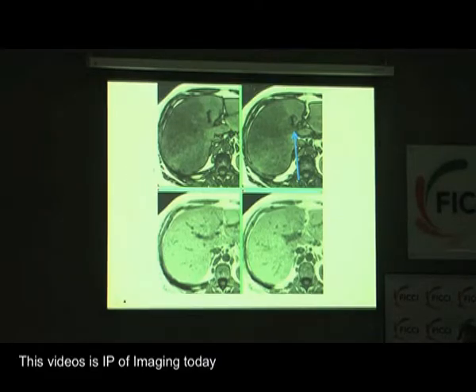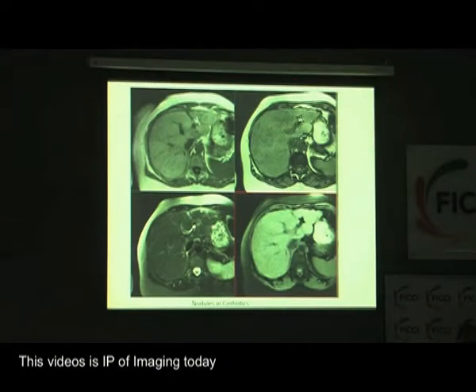And what you can see is that this patient has diffuse fatty infiltration. The degree of fat in different components of the liver is different. And this lesion, which was assumed to be metastatic, was nothing but focal fatty infiltration, which was to a greater degree of infiltration than the rest of the liver. This patient was subsequently biopsied, and of course it was confirmed because there was a high anxiety level both with the oncologist and the patient.